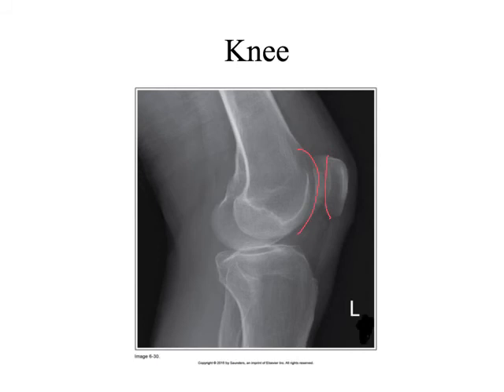Patellofemoral joint. We want to see superimposition of these structures. What do we call those? Yes, the femoral condyles. Good. Lateral and medial femoral condyles. We want to see those superimposed because if they're superimposed, we're going to see this joint space open more appropriately.